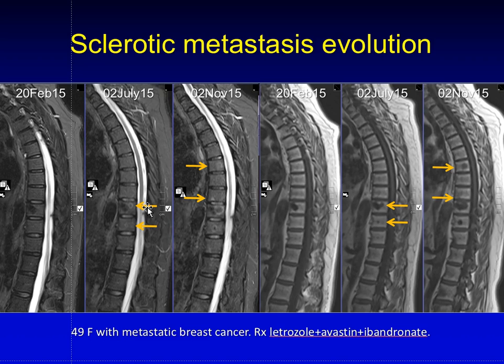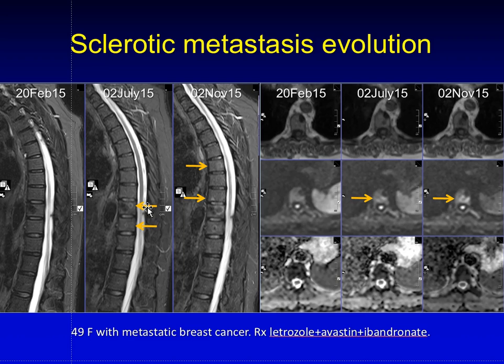And in fact, if you look on the axial images on the STIR sequence, if you just concentrate on that lesion there, which you can see is a small ring-like area that gets much bigger, that area classically has a higher signal intensity around the edges, indicating an area of therapy resistance.